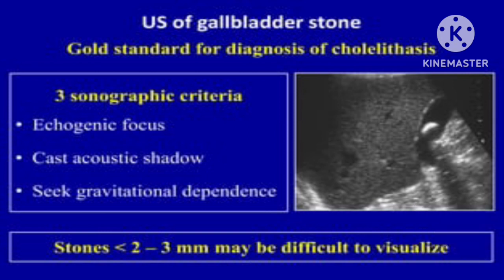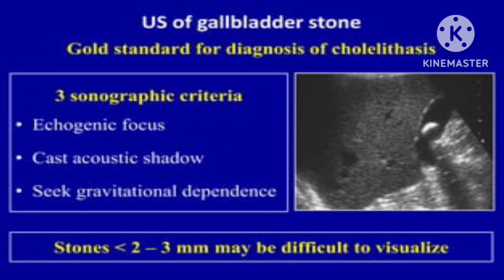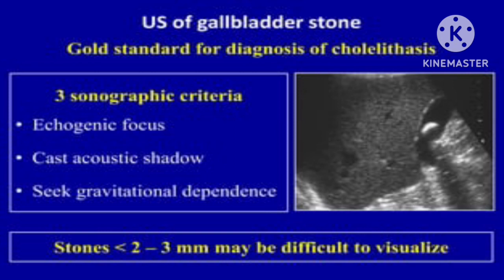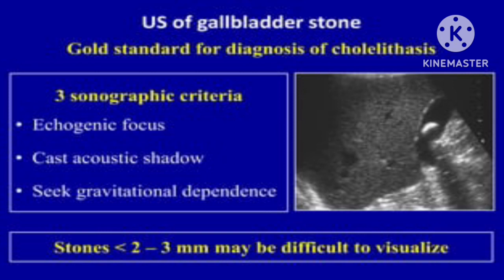Again, there are three gold standard features for diagnosis of cholelithiasis on ultrasound. Those are: first, echogenic focus; second, cast acoustic shadow; third, seek gravitational dependence. Remember, these are the three sono-criteria.